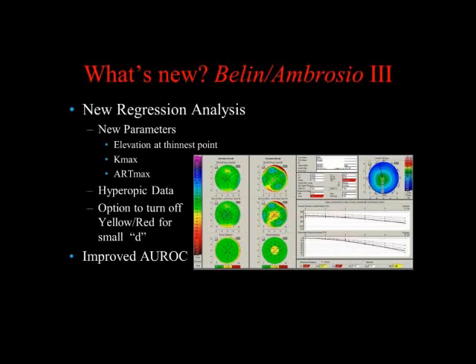We also gave you the ability, for those who want, to turn off the colors on the individual parameters only, not the final. The reason for that is there are some people, for medical, legal, or just their own reasons, who do not want a map of a patient that they took to refractive surgery, even though the overall reading is white and normal, to show a yellow or red in any parameter. And I can understand that.